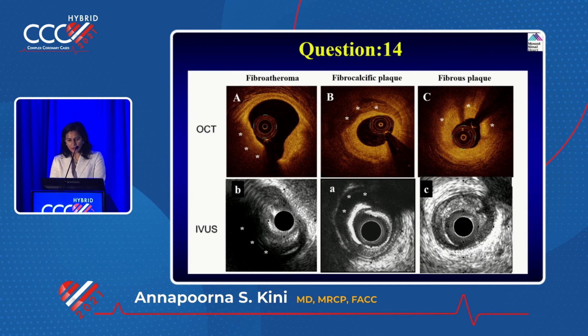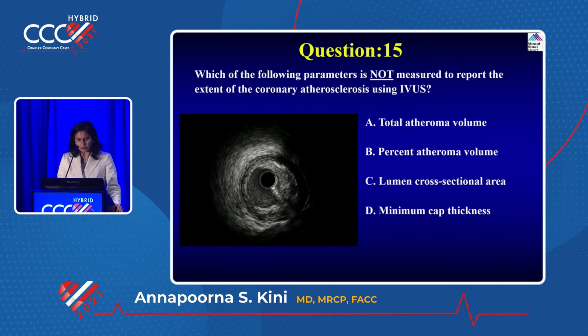So essentially it's fibrous plaque. B was a fibrocalcific. You see that, right? Calcium, calcium, and this is lipid, fibrous tissue there, fibroatheroma. You keep looking at more and more pictures because they can show you. So essentially you have to know how you differentiate the two.